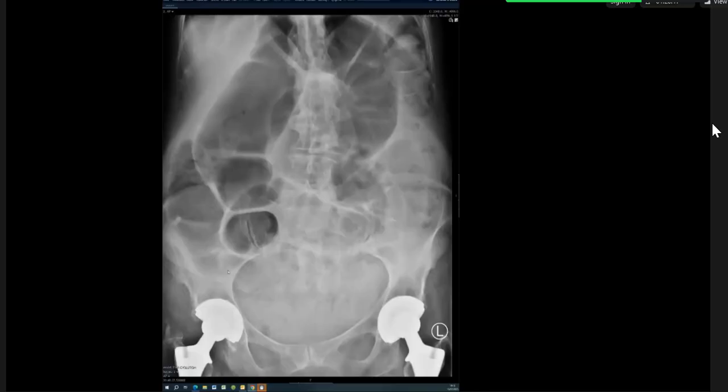If the right colon is dilated, the obstruction will be on the level distal to this site. Yeah. So the dilatation would be proximal or distal to the level of obstruction? Obstruction is distal to the level of dilatation. Obstruction is behind the dilatation.